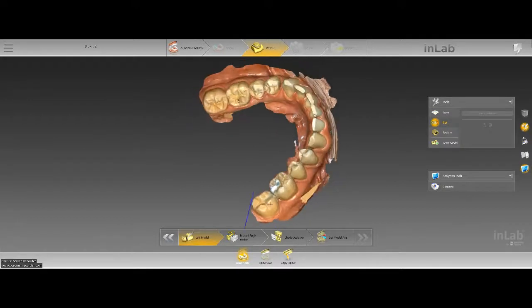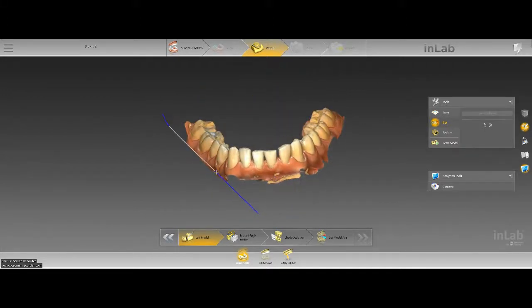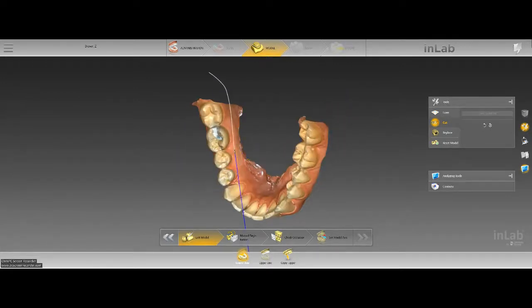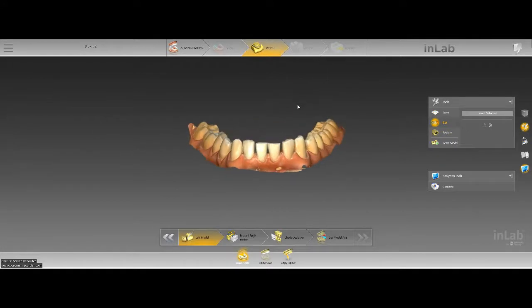Let's go ahead and remove all of this excess material on the mandible. At this time, the patient declined orthodontics, which you can see he would greatly benefit from in the lower anterior, but overall, we still have enough room to do some better looking anterior restorations. Let's get rid of this here. All of these areas are just going to be unsupported minima, which are going to create issues for our 3D printing process. So we'll go ahead and we'll cut that. And here we go.